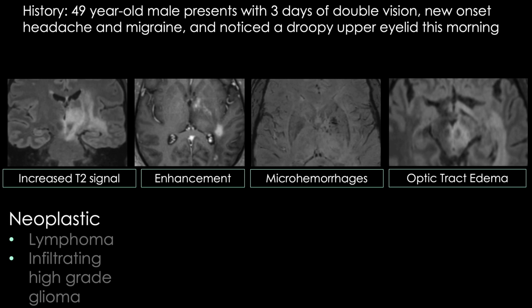We have these multifocal lesions, but there doesn't appear to be significant mass effect associated with it, a hugely important fact. Whenever you see a lesion in the brain, you have to ask yourself, is there mass effect or not? In this case, not. So that rules out many masses, but there are some particular ones worth considering. The most suspicious of these being lymphoma.